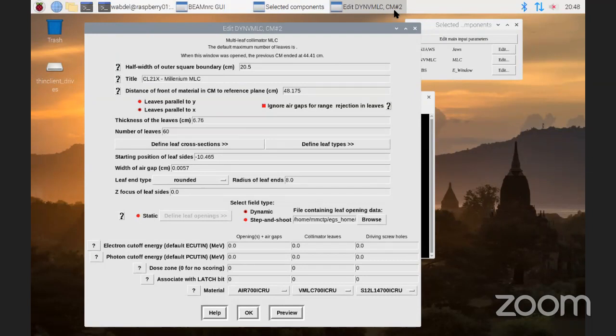Okay, and just for everyone's sake, when you drew that profile, are you drawing across one leaf pair? Is that what we were looking at? It's actually between both banks. So it's not from A to B, but actually the other way. Oh, okay, so it'd be along the Y direction. Maybe, along the Y direction. Okay. So then it sounds like one leaf is in when it should be out, or it's the thickness, like you mentioned.